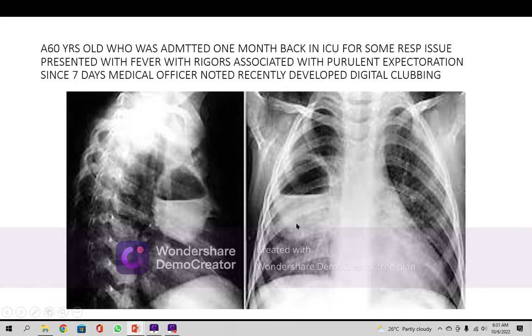The second one, it may be the result of chronic inflammation, meaning tuberculosis with cavitation is possible. The third one, another chronic inflammation which can cause this, is fungal infections. The fungi can cause any type of lesion. There are many presentations of invasive fungi.